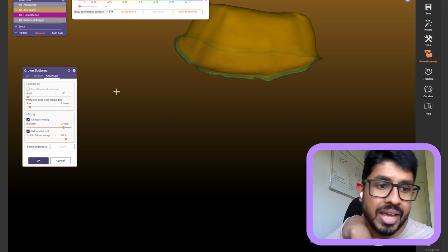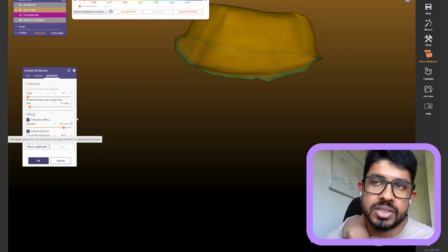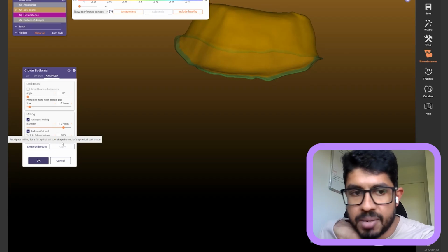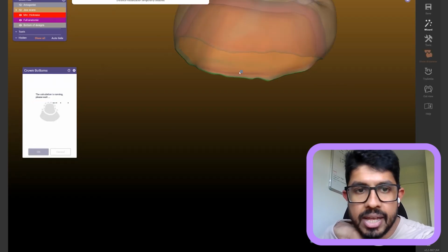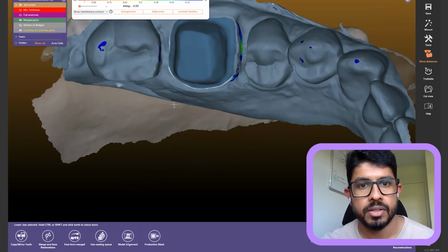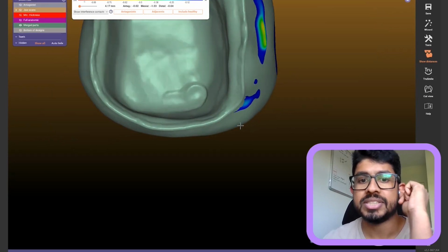If you're using exocad to go into a CEREC machine, this might seem complicated, but since this is being recorded, people can just go ahead and look at this and take a picture. Once you have this set, it's set permanently. You don't have to change it every time for each case. You just have to do it once, and you'll notice if I move forward to finishing my design and I say okay, do you see that difference? This is what you would see in CEREC.